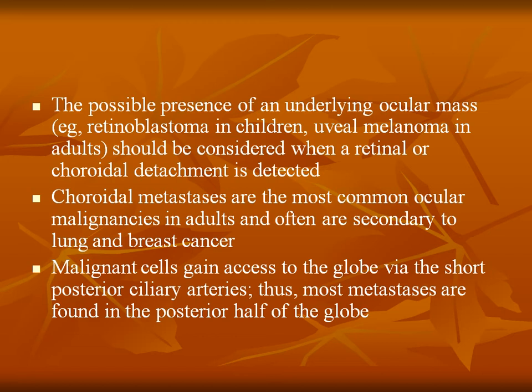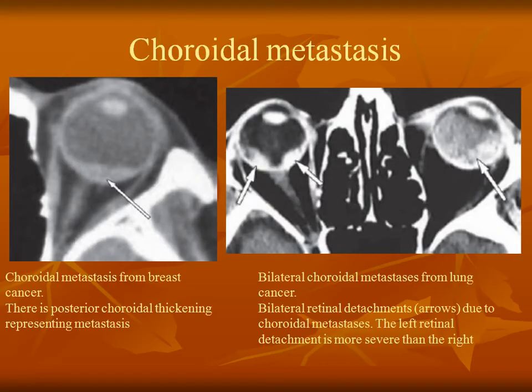Malignant cells gain access via short posterior ciliary arteries. Most metastases are found in the posterior half of the globe. You can see here, this one is choroidal or retinal? It's choroidal. The apex is not at the optic disc. Okay, it's metastasis from breast cancer.